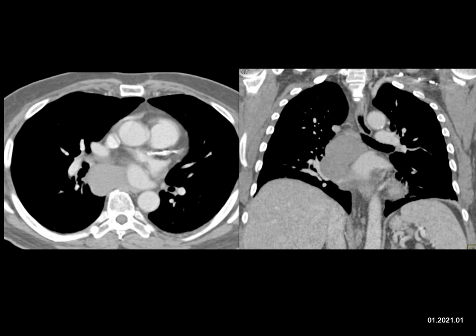It's a great location. It's subcarinal. There aren't all that many things that occur subcarinal. Without looking at the answers, you could think about things like adenopathy, but only in the subcarinal would be somewhat unusual, and this is kind of too low density. You can think about metastatic germ cell tumor, but again, just to the subcarinal region is just not going to cut it. What occurs in the subcarinal region?